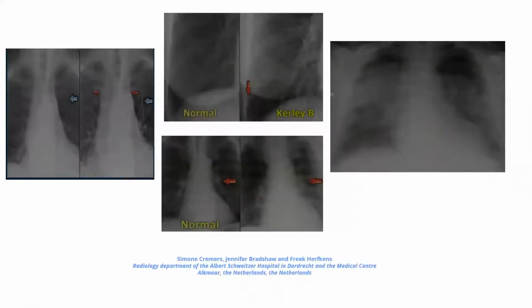Now, the level of congestion is important for us. Initially, before we see the patient at this stage, he probably passes through a milder stage of congestion. The first stage we usually allude to is the cephalization of the veins, or upper lobe diversion of the veins like this one. So you see the venous system is congested upwardly, or apically. Then if you focus at the mid-lower zones, you will see Kerley B lines here.